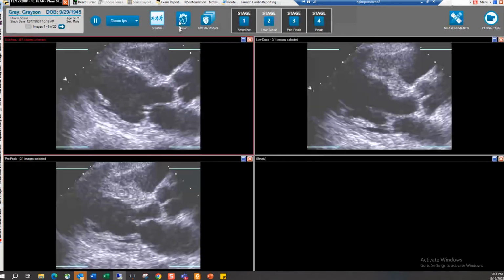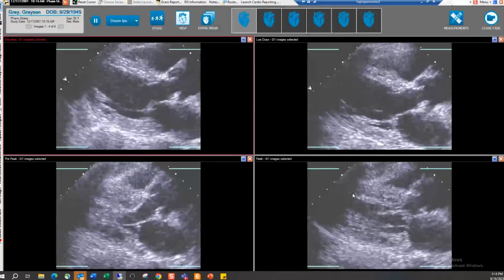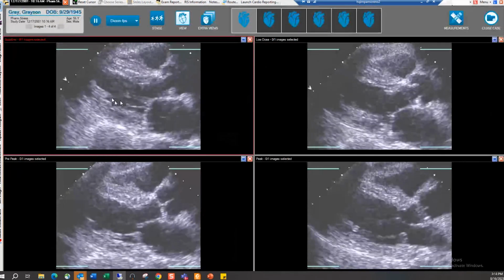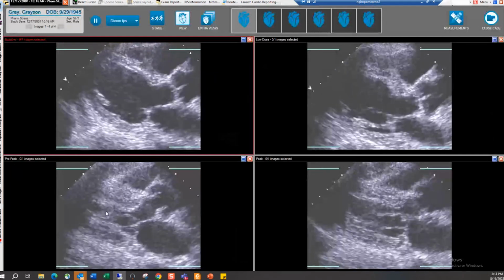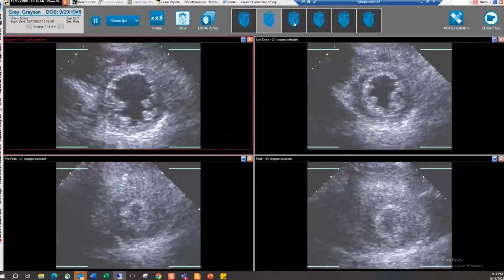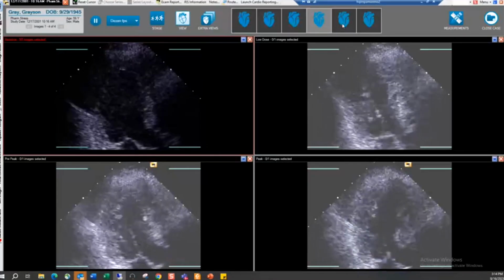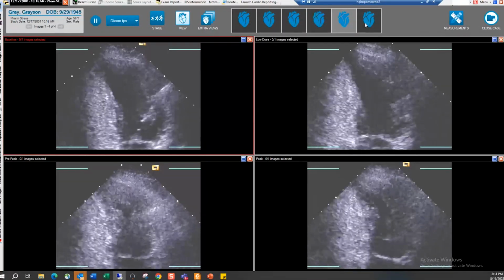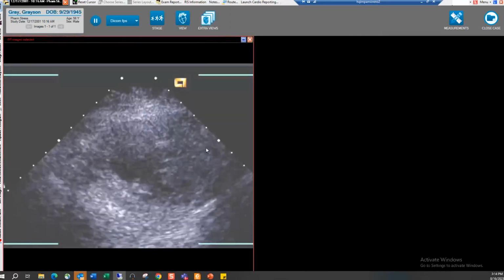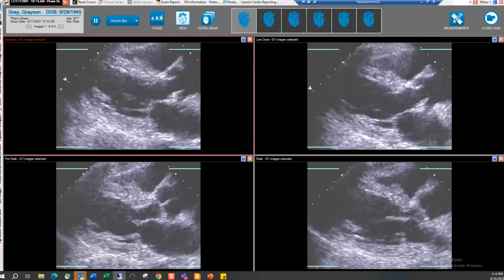If you press view, it brings us a different view. So these are the different, this one's a peak here on the right, low dose here on the top right. It's the baseline on the left and the pre-peak on the bottom left. And then you can see I can press these buttons up here. There's also extra views if they exist. You can do more measurements here also.